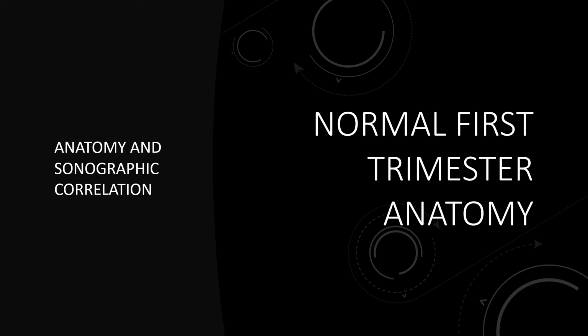In this session, we will focus on first trimester anatomy with an emphasis on anatomical landmarks and their sonographic correlation. Mastering the visualization of these early structures is essential not just for confirming viability but also for setting the stage for early diagnosis of anomalies and guiding optimal prenatal care. Let's begin by exploring what we should expect to see and how to systematically interpret it.